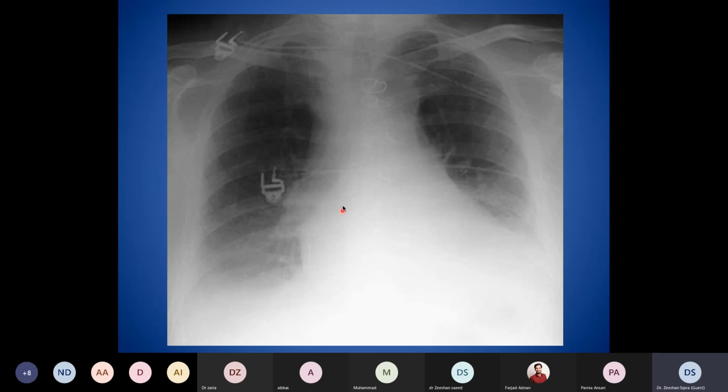And we cannot really comment on the center of the image. This is the heart actually. The recommended guidelines for reporting radiographs say that we should not comment much on the heart size on the AP view, and we can better appreciate it on the PA view. Massive cardiomegaly is another thing that we can see, the heart shadow going beyond 2/3 of the image.